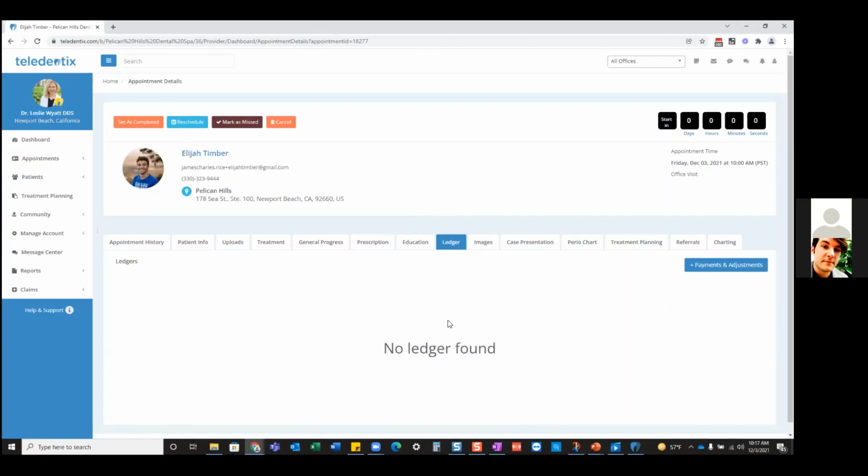One thing that I want to point out in regards to the treatment codes. You may have noticed that when I was entering procedure codes into my patient's routing slip, there were no fees associated. So just keep that in mind. The reason we did that is because right now we do have the ability for you to enter different fee schedules, and we're just not able to get to that information while you're offline.